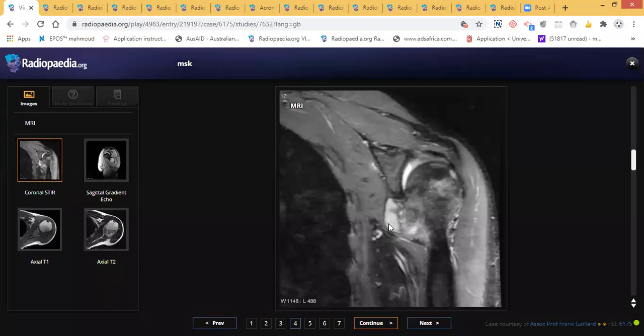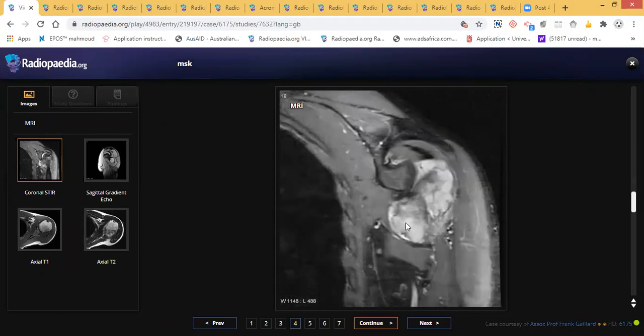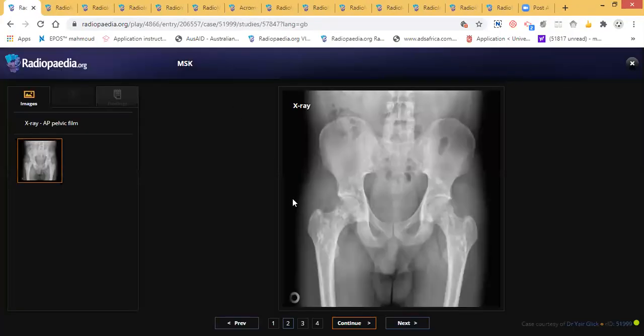If it exceeds more than 15 millimeters, I think, 1.5 centimeters, then you conclude that this patient underwent malignant transformation. Osteochondroma is one of the good differentials, especially if you have any previous history, and when you see this cartilaginous cap exceeding, and not just exceeding but transformed to soft tissue, this means that this patient developed malignant transformation.